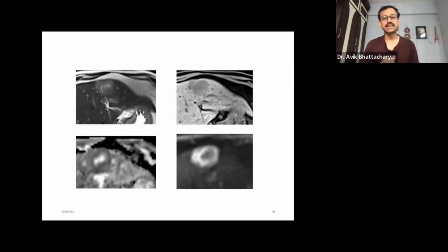Well, as I said, if it is a hydatid cyst which is CL stage, it is a clear cyst, there is an imperceptible wall, then really it is very difficult to differentiate a simple cyst versus a hydatid cyst. Many times we send IgM for hydatid echinococcus and all these things. Most of the time the report becomes negative. Then we are back to square one. A simple cyst versus a CL stage hydatid cyst is very difficult to differentiate. If we see dependent hydatid sand or dependent debris, it will favor the hydatid etiology.